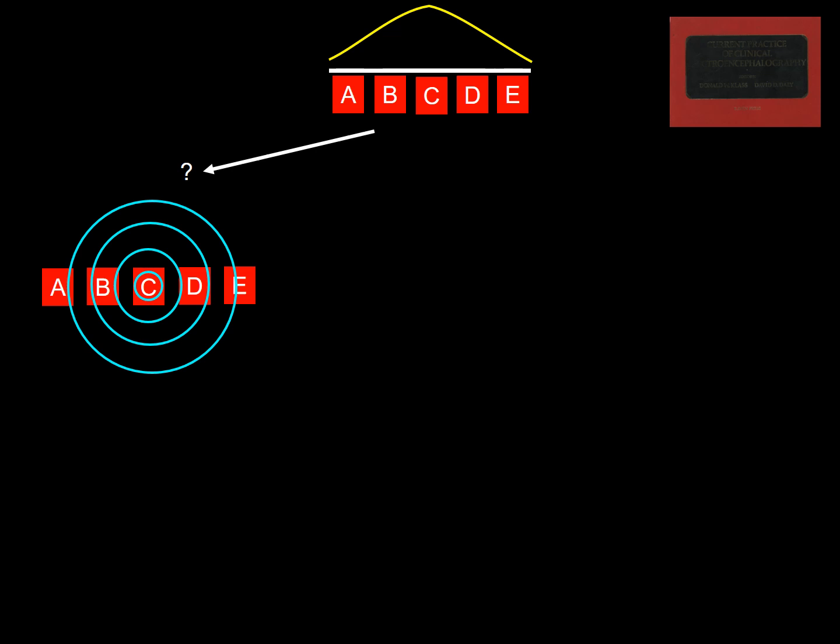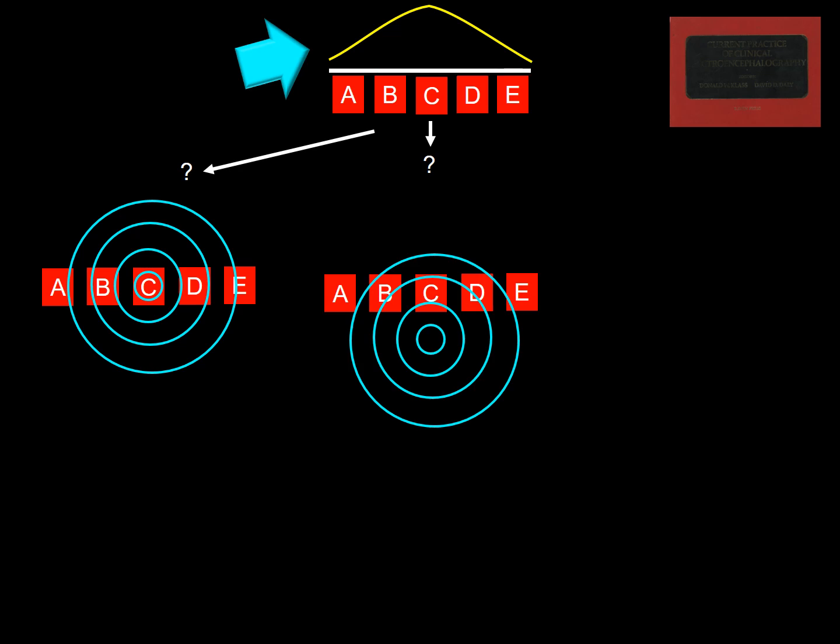a white line. And above them, I have placed a miniature voltage electrode position graph. This graph corresponds to the one I have shown you before. As you can see, the maxima in this figurine is arising from under C. In this new figurine, the voltage graph has not changed, but the epicenter of the field is not right under electrode C, but C is still the electrode most involved.